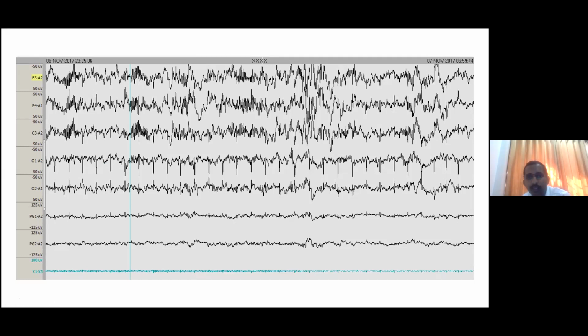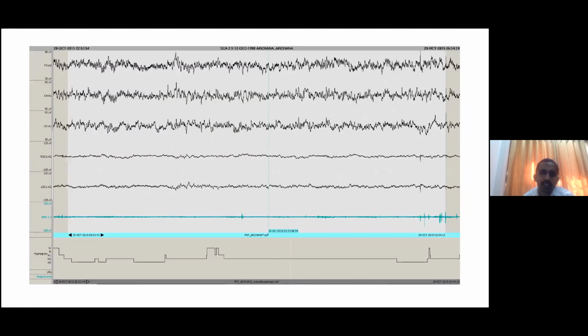There is no confusion there; any beginner who has identified it once or twice or ten times can say this is N2 stage. But in studies in these patients we have some confusion about whether there is a sleep spindle; you have to search for it, and there is low EMG and phasic REM on the EEG. In this kind of situation, deciding when to continue N2 stage and when to continue REM sleep largely depends on the previous epoch.